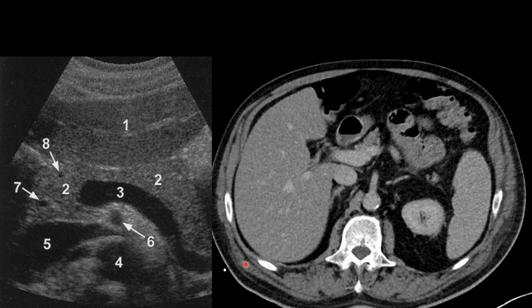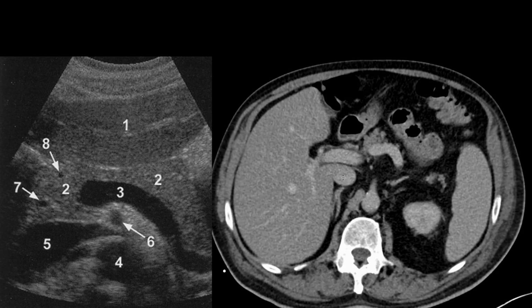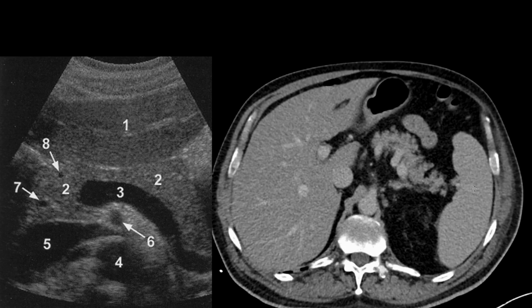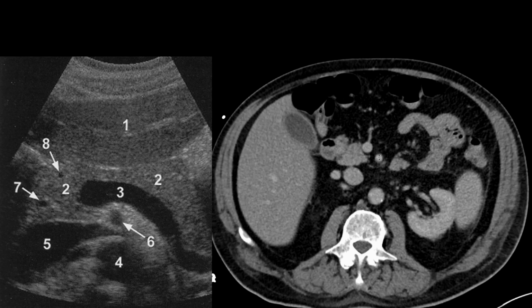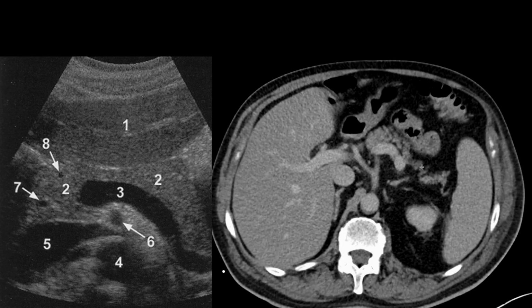Okay, let's go over the abdominal anatomy on CT. Here's big red, here's big blue. Realize the aorta is left of midline, IVC is to the right of midline, and here's our portal vein going into the liver, made up of the splenic vein coming from right to left and joining the SMV. And note here is our SMA off the aorta, and the SMV is to the right. Which organ is right in front of the splenic vein? Well, that's going to be our pancreas.